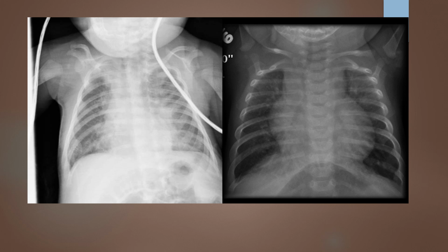So first of all, we'll look at both of these for the anatomical presence. So we have apex to angle, angle to apex, apex to angle, angle to apex. All the anatomy is there on both of them. Okay, so next we're going to compare these. Obviously they have very different techniques utilized. I'm looking for soft tissue detail, bony trabecular pattern, adequate penetration, cortical outline.